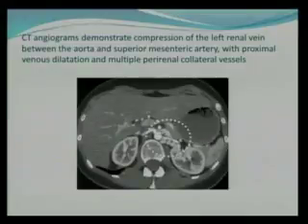Here you see marked impingement of the left renal vein. There's pre-stenotic dilatation. There's dilatation of the gonadal veins here. And this patient is having hematuria, so that's not surprising.